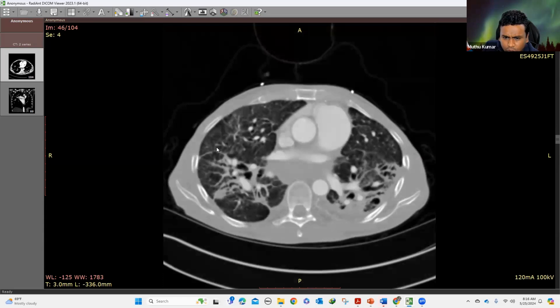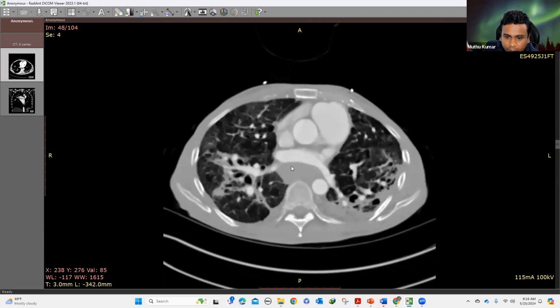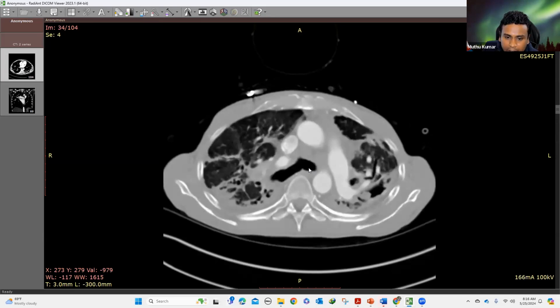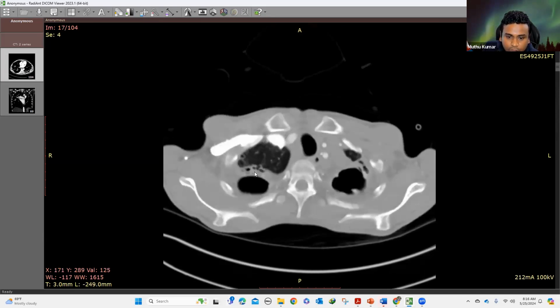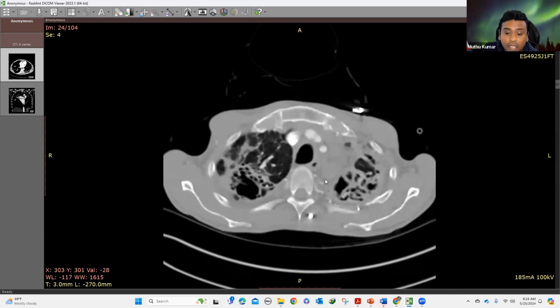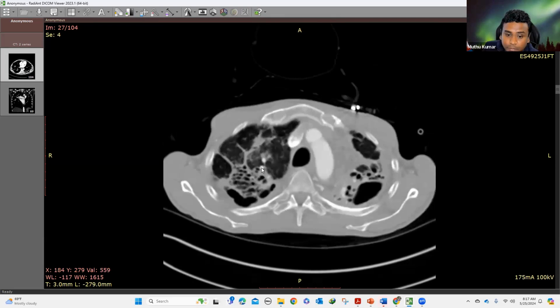You can see there is a conglomerate soft tissue within the mediastinum, and you can see how the left atrial posterior margin is buckled up and pushed anteriorly. And you can clearly see there are areas of traction bronchiectasis, architectural distortion, and biapical cavitary lesions. This can happen in sarcoid, and these cavities can get seeded with aspergillus, and aspergilloma can occur.